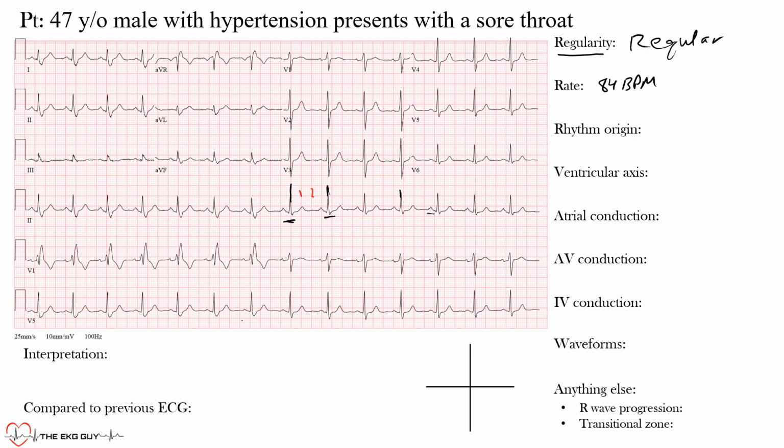So 1, 2, 3, between 3 and 4, okay? And you would do 300 over the number of thick lines, which we said was 3, is 100 beats per minute, okay? But it's really between 3 and 4, so you do 300 over 4 as well, which is 75 beats per minute. So the rate really falls between there, okay? And a little closer to the 4 end, that's why it'll be closer to the lower end, okay?